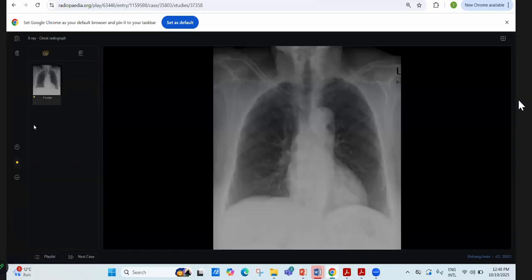Okay. This was your case. A little bit of a problem was there because you said straight away, I think, met or mass. Solitary pulmonary nodular mass, yeah. Because I think it is quite visible, like a tubular appearance, and you didn't pay attention in the beginning. Maybe because the image is small, or it's projectional.